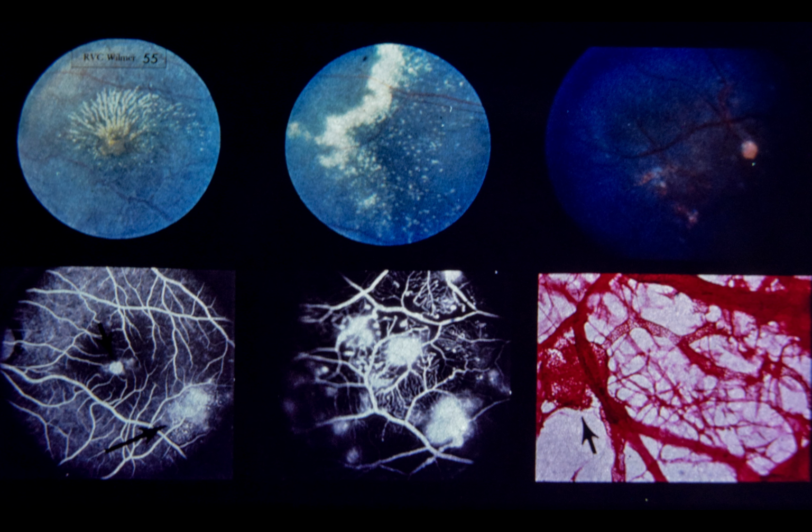Comment: the presence of a fibroglial nodule in the central fovea indicates chronicity and a rather poor visual prognosis, since the sensory retinal elements have likely been damaged irreversibly. Photocoagulation treatment to areas of peripheral telangiectasis may reduce further lipid deposition in the macula, however. In time, the macular lipid may be reabsorbed and further visual deterioration may be halted.